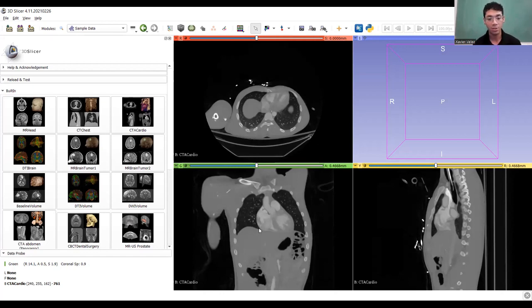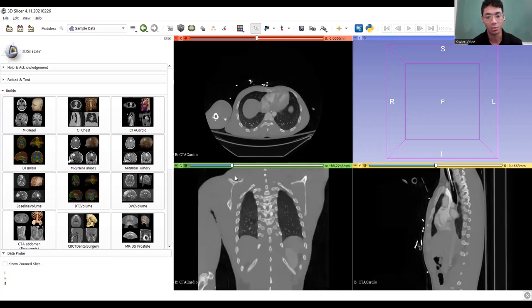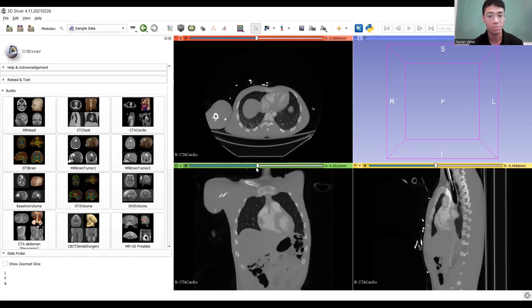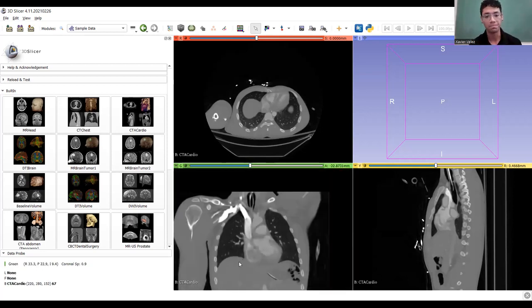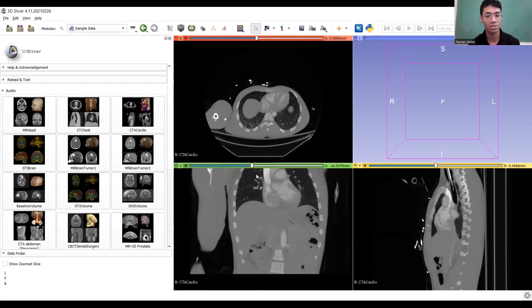So first things first, where the heck even is the liver, right? It's a super weird body part, it's probably around the stomach area, but how do we actually know what in all of this mess is the liver and what's the rest? You guys can probably tell by the fact that this is named CTA cardio that this file is primarily used for heart segmentations. This was actually the same file that I used in one of my previous workshops where we segmented the heart. But it's tough to see what we're going to want from this.